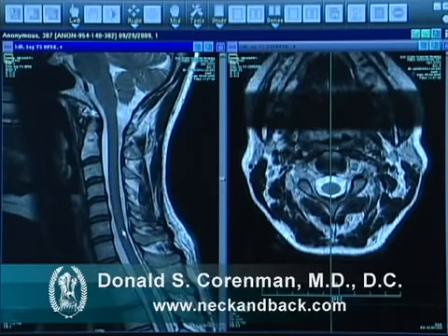the way down the spine from the top to the bottom and ends in the lumbar spine. The white stuff on either side of this is cerebral spinal fluid, which is simply water. Your brain and spinal cord float in water. You can see the individual vertebra here, and the discs in between the vertebra. The first and second vertebra are very different than the rest. The second has a big head and the first has a small ring.